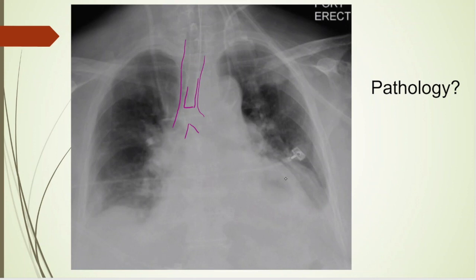So, looks like the gastric bubble, looks like this diaphragm, this is just a mess here. This is one that I would definitely want a radiologist to overread, but for our purposes, we know the endotracheal tube is not right mainstem, although it does need to be pulled back a little bit. Looks like this is the right diaphragm.